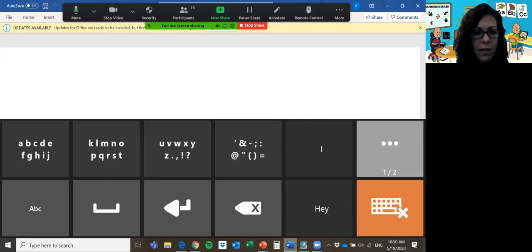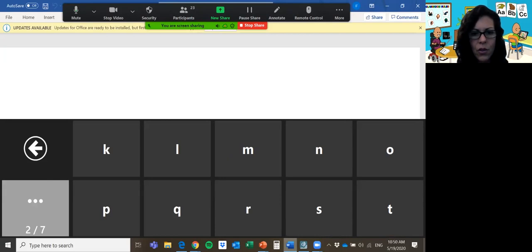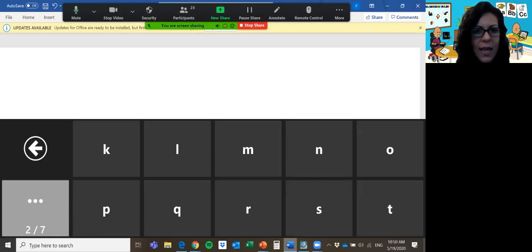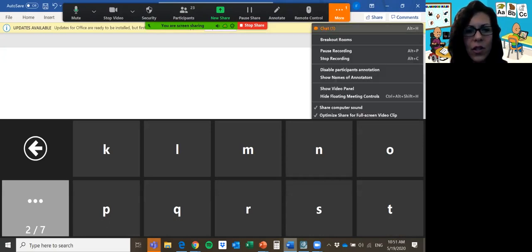So we talked about choosing the letter M earlier. Oh, and here, if you can see this, this is the word prediction. And then you can close out of the keyboard here. And I'll just show you if I wanted to, oh, sorry. Type the letter M. I think it's because I'm not using eye gaze and it's set for eye gaze. So sorry about that. But if I had my eye tracker connected to my laptop right now, I would be able to select the letter M and then it would show up on the screen. Does that answer your question?